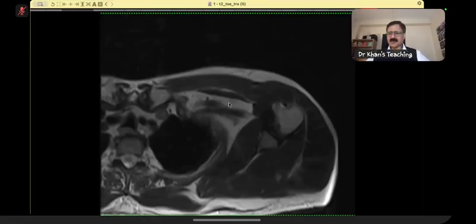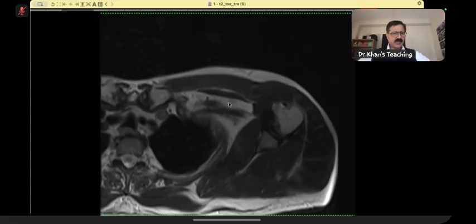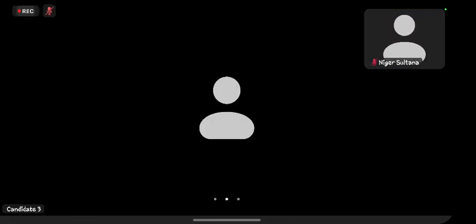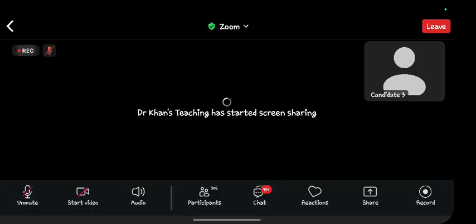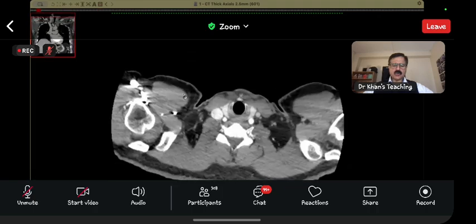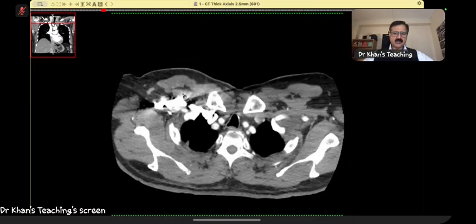Well done. Sir, neurofibromatosis type 1 can have multiple neurofibromas. Sir, these are neurofibromas. Basically, schwannomas and neurofibromas are possibilities, but if other criteria are met, it can be solitary schwannomas. Okay, let me take over. So this is a case of multiple schwannomas arising from the brachial plexus.